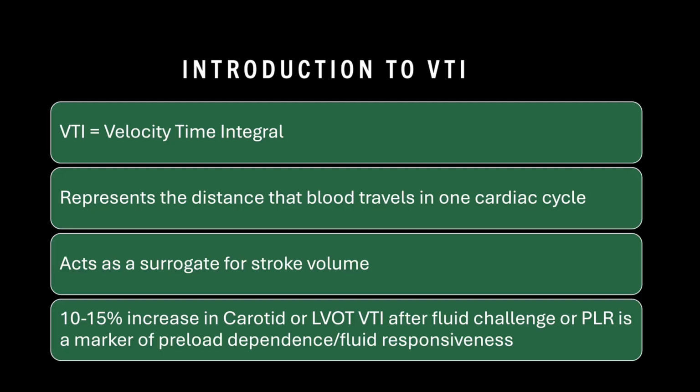So, introduction to VTI, starting to get into what we are going to be talking about today. VTI is the velocity time integral. It represents the distance that blood travels in one cardiac cycle, and we are utilizing it because it acts as a surrogate for stroke volume. An increase in VTI, whether that be carotid or LVOT, after a fluid challenge or passive leg raise, is a marker of preload dependence, meaning fluid responsive. The main point here being we are tracking change over time or in response to a physiologic change.